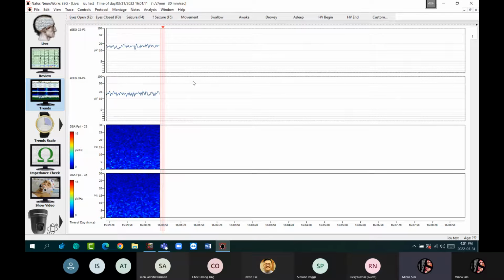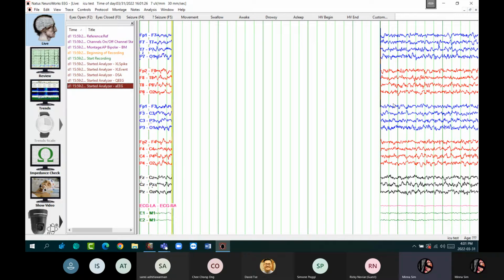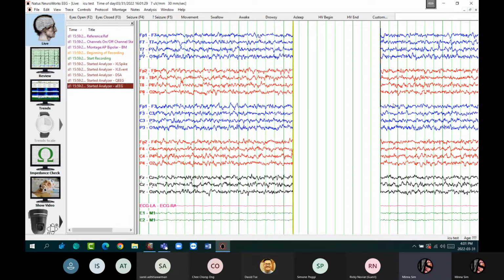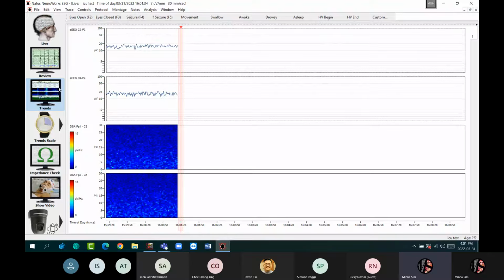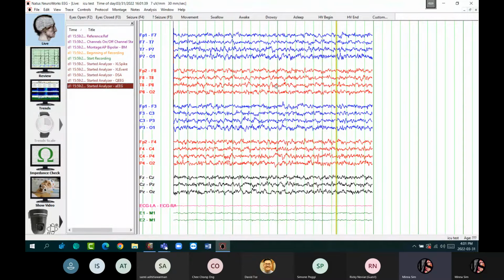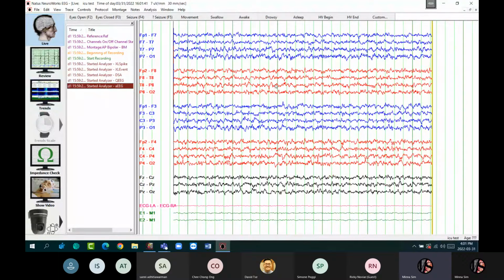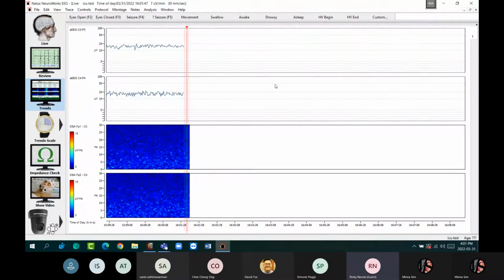This is good in a sense whereby there are a lot of people looking at this EEG. For example, I'm the doctor, I come here, I want to see what's going on in the EEG data, and then I forget to change it back to the trends panel, which is what the ICU people would like to look at. So this feature will allow the system to auto switch to the trends. So it is useful in this way. Okay, thank you.